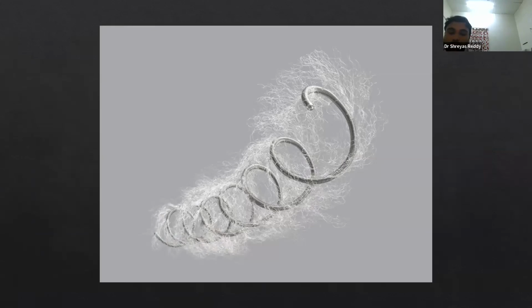This is a coil. Yeah, what is this coil called? Fibered coil. Exactly, it's a fibered coil. What is the coil made of? Platinum. So the platinum coil is used for permanent embolization anywhere. Aneurysms, peripheral bleeding, anywhere. We have used it for rectal embolization. So this is a permanent embolic agent. Okay. So this is a coil.